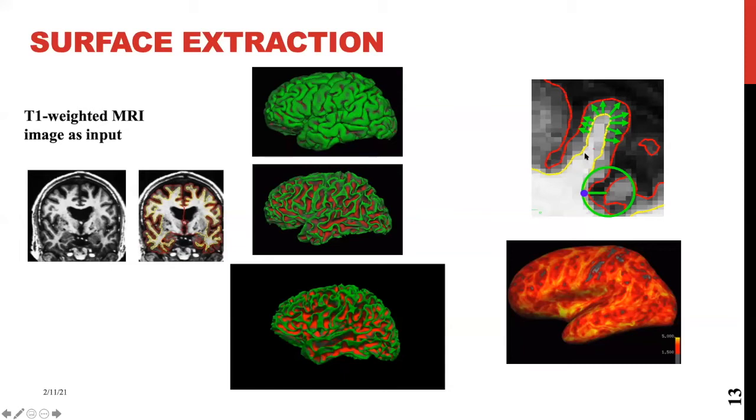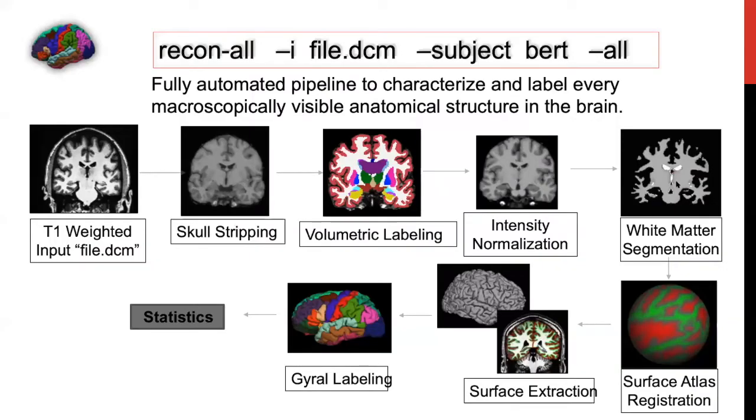But the important thing to know is that FreeSurfer cares about the white matter the most in terms of editing purposes, because once the white matter is created, if we want to go back to this step, it segments out that white matter, and then it will grow the pial surface from there.